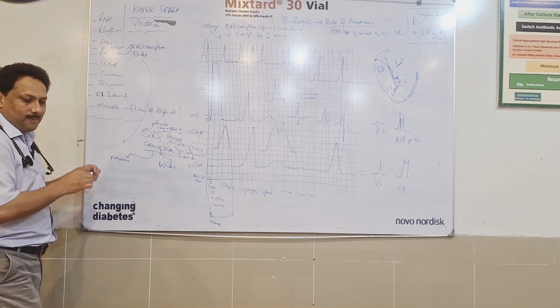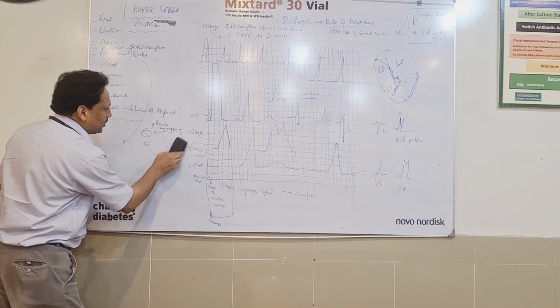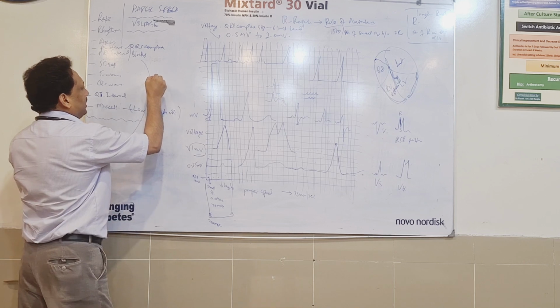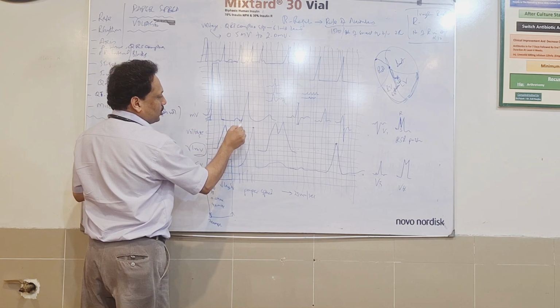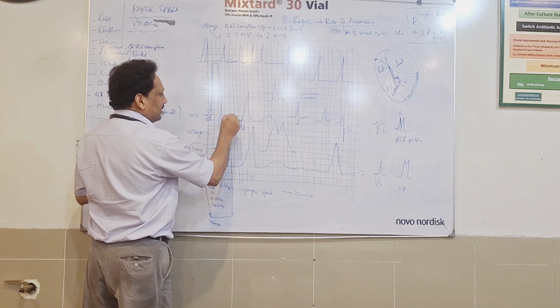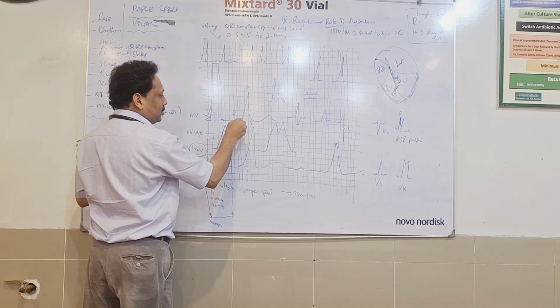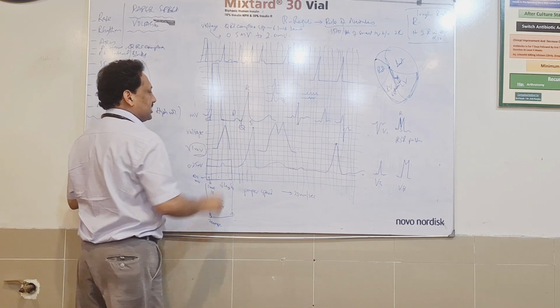Now this QRS complex, first I wanted to guide you how it looks and what its normal sizes are. In an ECG, this is QRS complex. A wave which goes down is the septal depolarization wave. We call it Q wave. This is R. This is S. So this is QRS. This total is known as QRS complex.